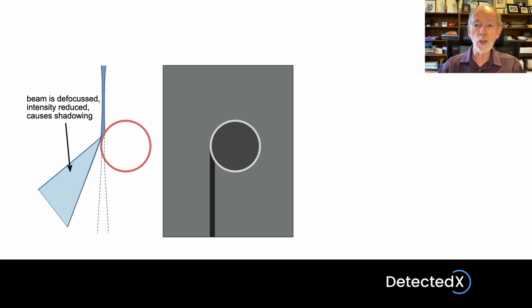Most of the time it's not at all useful because most of the time we can see there is a curved structure causing the edge shadowing. Occasionally it may be useful, but this normally falls into the category of artifacts that we will recognize and therefore know to ignore, but it's neither a problem nor useful.